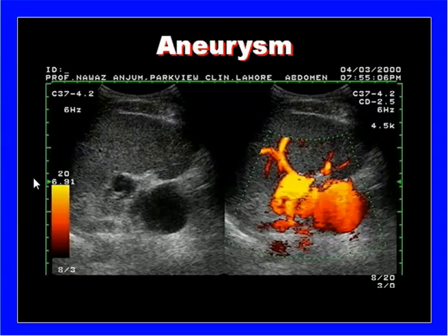Aneurysm of the renal artery is not a very common problem, but when it occurs, it may have the ultimate problem with the renal function. Here is the picture. On the left of the screen, it's a right kidney, you can see the liver. The rounded structure on the left side is just dilated renal artery, and on the right of your screen, when the Doppler is on, you can see this is all filled with color and it shows moderate renal artery aneurysm.